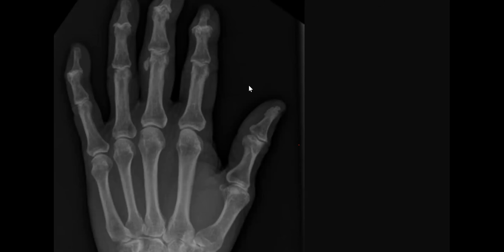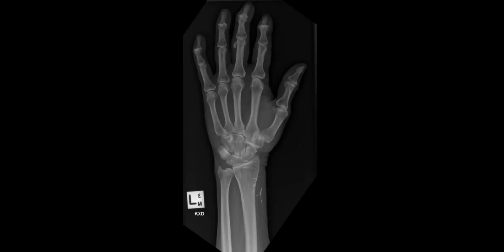Okay, and the laboratory tests as well. Yes, sir. Serum check of renal function, thyroid and calcium level, and maybe parathyroid ultrasound. Very good. So this case has two unrelated pathologies. The distractor is erosive osteoarthritis with seagull sign, and the hidden pathology is secondary hyperparathyroidism with dialysis fistula formation.